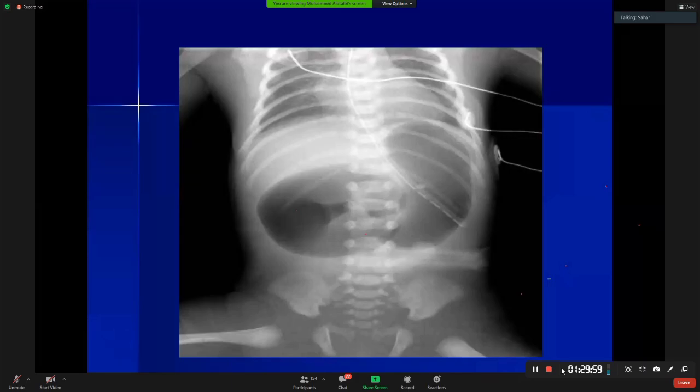That is, the distal small bowel and large bowel are gasless. Also, the patient is in an ICU setting with some leads. In my provisional diagnosis, I would put the double bubble sign, that is duodenal atresia. I will go for ultrasound and barium meal follow-through to find whether the cause is Ladd's bands or annular pancreas. Okay, excellent descriptions.